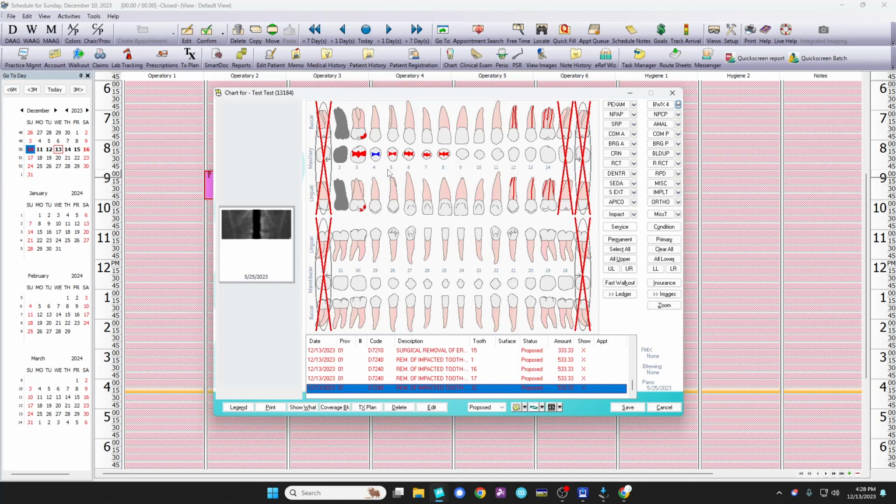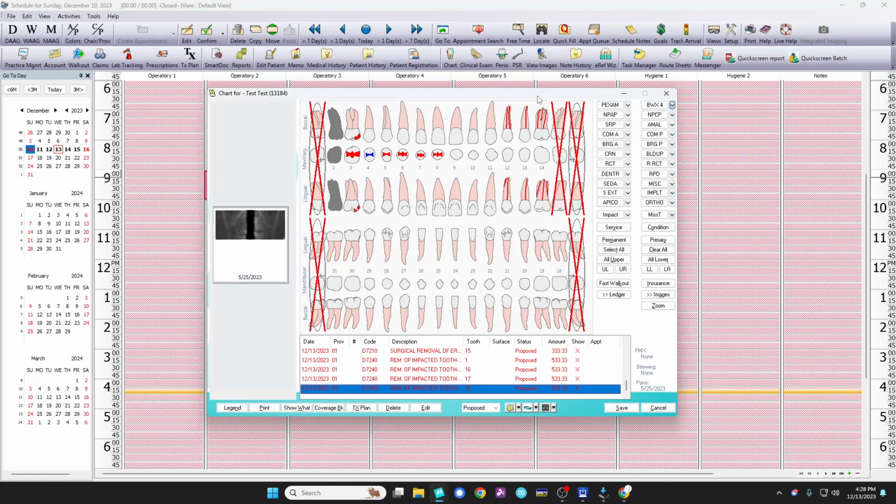And so if you watch some of the more experienced assistants, you're going to see them clicking through the odontogram and the charting mechanism to be able to chart that almost at that speed. So it's very important to get very good at this very quickly, because you want to be proficient in front of both the patient and the providers in getting this charting mechanism, so that we, as the providers, can read it off very quickly, and we don't have to pause and have you correct things.